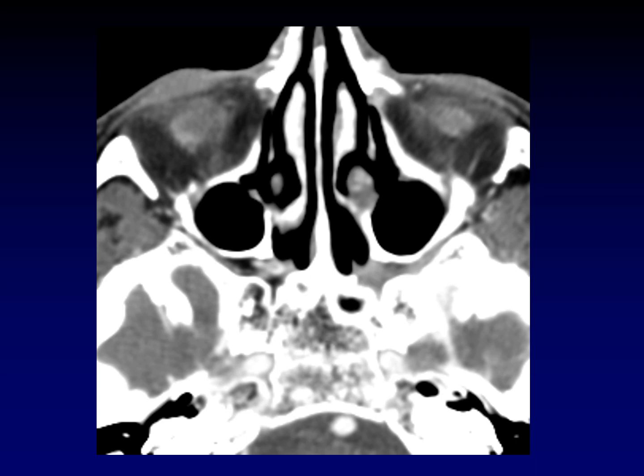Here's an example of how we can use that to our advantage, right? In this pterygopalatine fossa, there's the expected fat. There's also the sphenopalatine artery running through there, okay? But on this side, all that fat has been replaced. This happens to be perineural spread of tumor. Infection could have a very similar appearance, but this is how that fat can be useful to us radiologically.